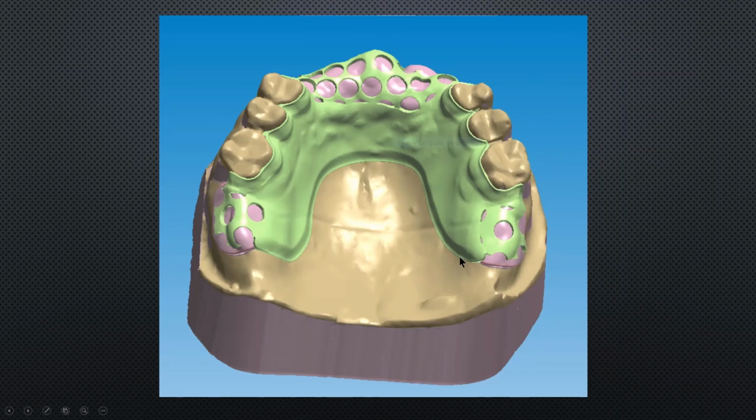Once you mark your major connector, so with the major connector and software for 3Shape, it kind of has you mark two different spaces. You'll mark your major connector, and then you'll come around to kind of the necks of the teeth, and you'll mark that, and you'll go along and you'll go to the necks of these teeth. And then secondarily, it has you mark the top half down to that lower half. And the reason it does that is it'll put texture, and whatever texture you choose, on just the material from that secondary marking down. And then from the second marking that you do on the linguals of the teeth, it'll make it nice and smooth and shiny.